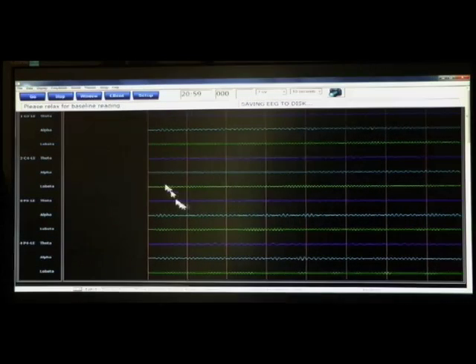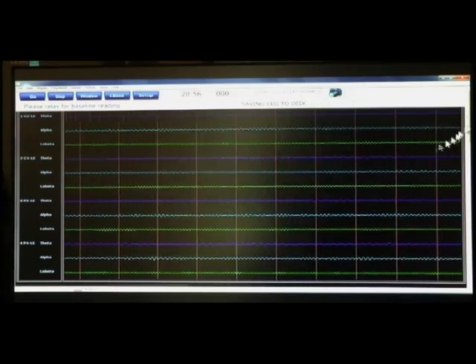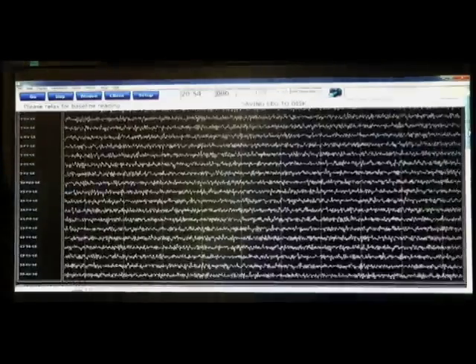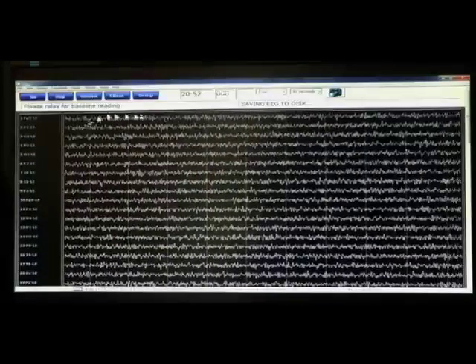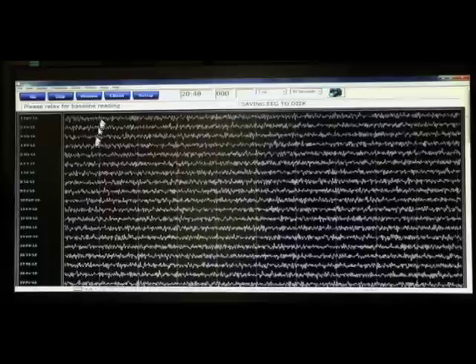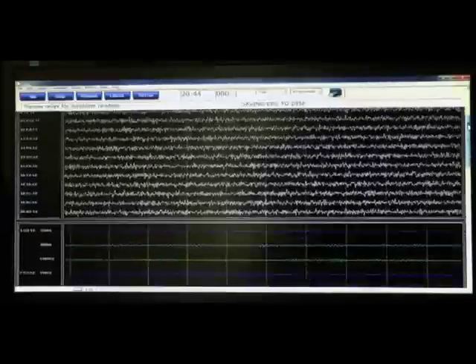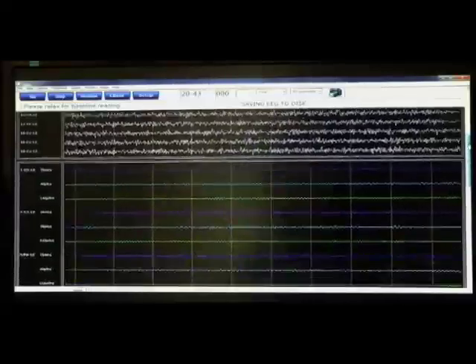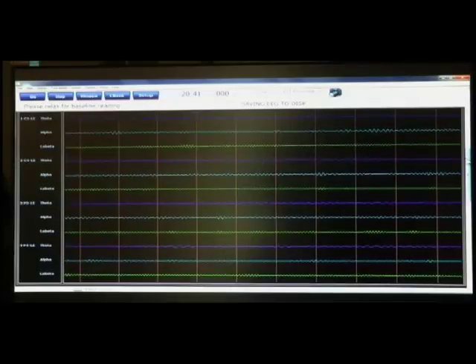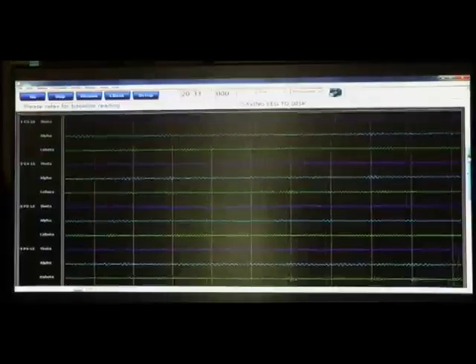So I see to start session, hit OK. So I click OK and I see my filtered waveforms. Now, this is a 19 channel Discovery, and we see all the different channels being acquired. With Discovery I could also just acquire the 4, but this will show you one additional option of having a Discovery where I can be recording all 19 even though I'm simply training on 4.